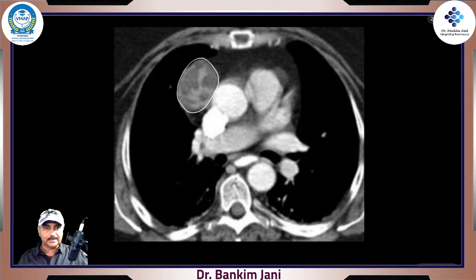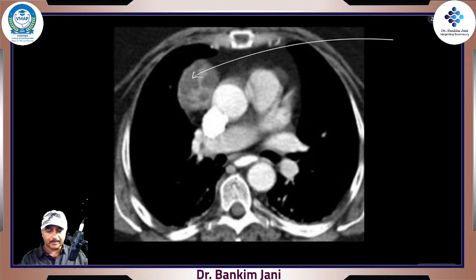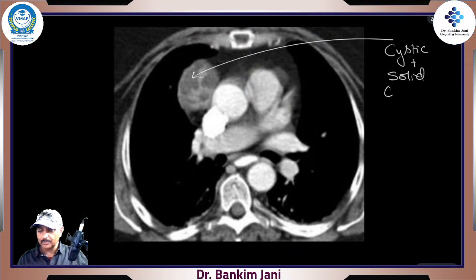Now we are dealing with this structure, the structure which is not in the center, right? It is on one side, but the look itself is telling us that this is not as cystic. There is some cyst, but then there is so much mixture, right? So that is where the solid components are also there. So this area, and this one, this is cystic, plus there are solid components. True? Solid components.